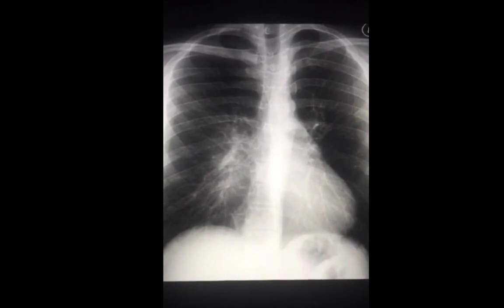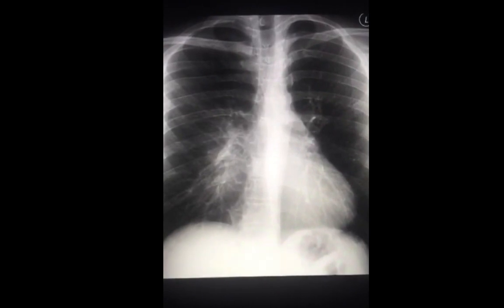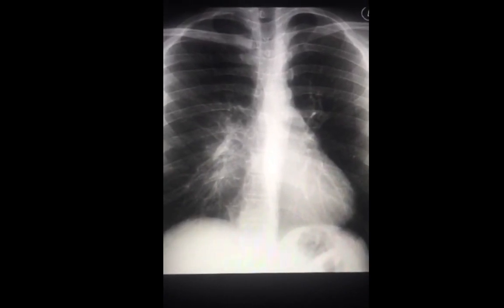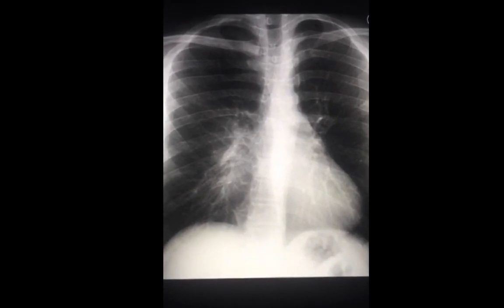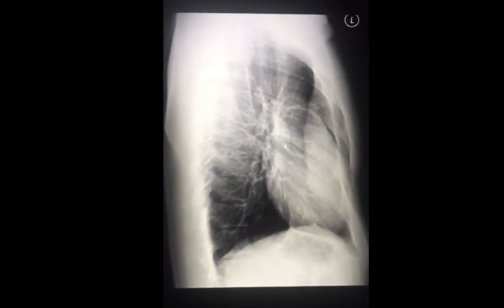To summarize the findings, pectus excavatum has the following: an ill-defined opacity along the right cardiac border, possible obscuration of the right cardiac border, deviation of the heart to the left side with a maintained centralized mediastinum, a more acute oblique course of the right-sided anterior ribs compared to that on the left, and of course, it's an easy diagnosis by looking at the lateral chest radiograph.